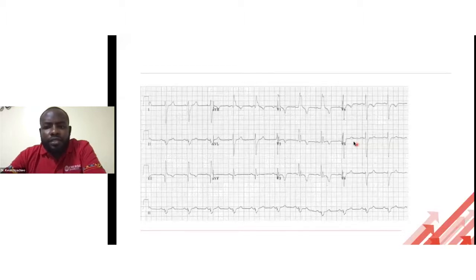When you do the ECG, this is what you're seeing. From the history again, just from the history, Wells score, high-risk patient has chronic malignancy. She's not able to move, so she's more or less immobile. Okay, difficulty in breathing. So she ticks all the boxes for pulmonary embolism. You score her on Wells score. She scores very highly, do CTPA. But before you do the CTPA, there's an ECG done. This is what you're seeing.